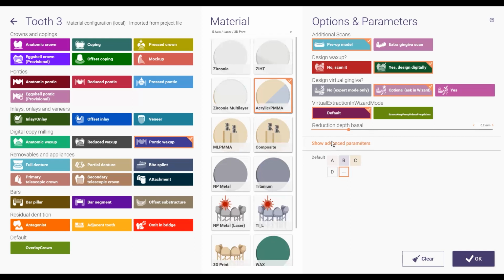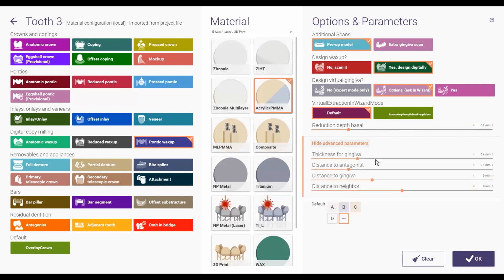Okay, so now from here, I can select the shade. I can just change these things, and show parameters. I don't have to touch anything because I'm not modifying the gap, the abutment, the implant libraries, or anything like that. Then after that, I just click OK.